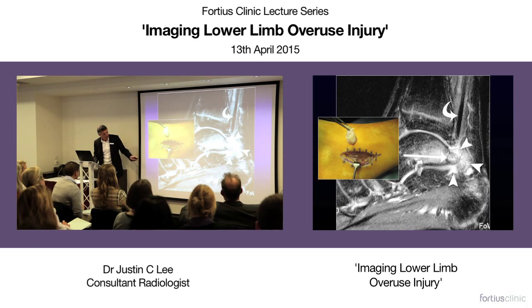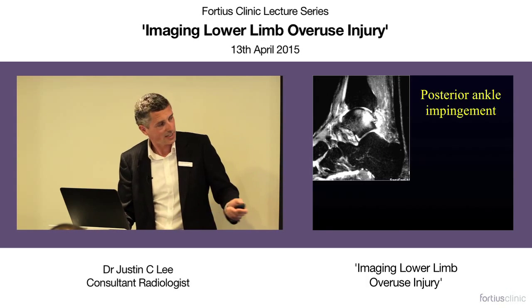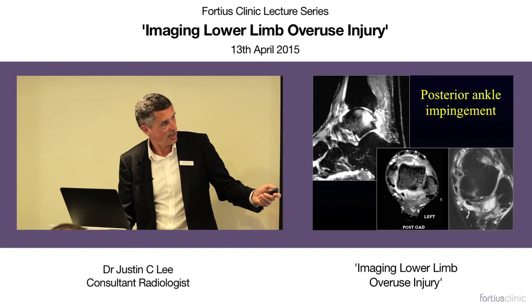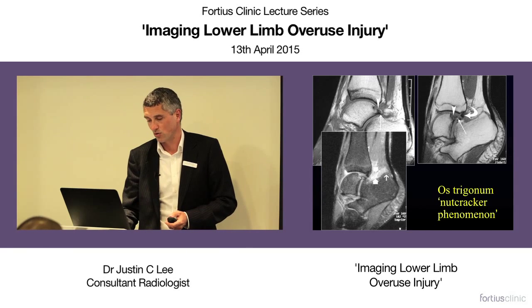Typical MRI, lots of marrow edema at the back of the talus, lots of marrow edema in the ossicle itself. And again, another appearance now where you've got lots of inflammation in the back of the bone, lots of posterior capsulitis, and this is the so-called nutcracker.